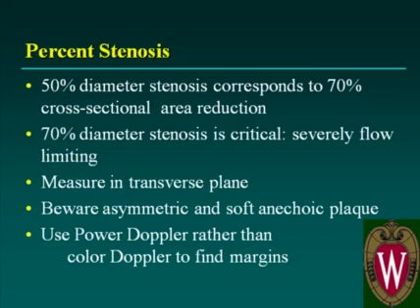This type of stenosis is typically measured in the transverse plane, but beware of asymmetric or soft anechoic plaque, which can be missed. In general, power Doppler, if available, can define the margins of the plaque with greater precision than color Doppler.